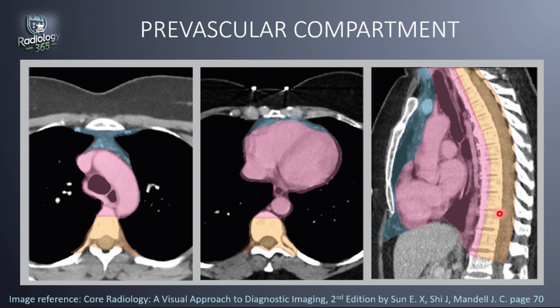That's the yellow compartment here. The anterior boundary of the paravertebral compartment is basically what was the posterior boundary of the middle mediastinal compartment or the visceral compartment, and that's 1 centimeter behind the anterior margin of the vertebral bodies.